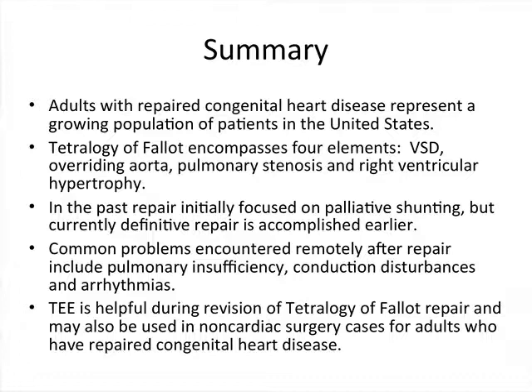TEE is helpful during revision of tetralogy of Fallot repair to assess the quality of repair, any residual stenosis or insufficiency of valvular structures, and may also be used in non-cardiac surgery cases for adults who have repaired congenital heart disease to evaluate cardiac filling and myocardial function.